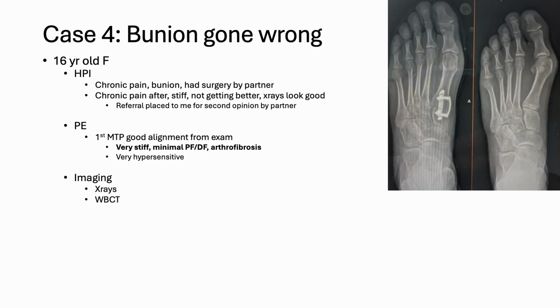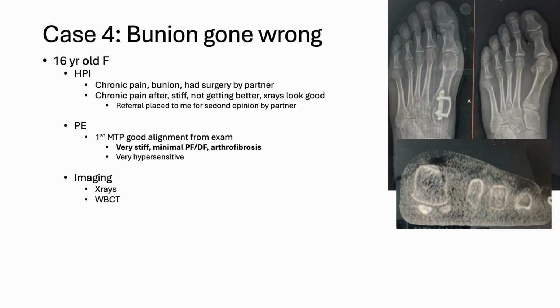So here's the postoperative and preoperative exam. Again, I would say that my partner did a good job. I think it looks great. I think that, all in all, he had good correction. I maybe would have added an Akin in my hands, just saying that I would have wanted it to be a little bit straighter based on a young patient, and I'm going to get that hallux valgus as best as possible. But that's neither here nor there in my opinion.